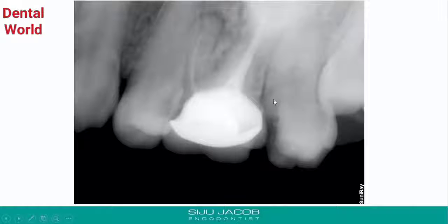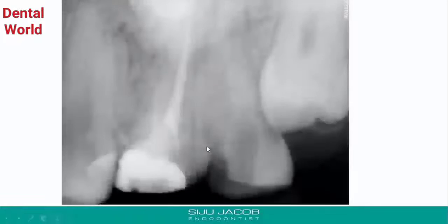I don't know what happened after that, but this patient came back after 6 months, and when she came back, I took a radiograph. This is what I found. Meanwhile the crown had disappeared. I'm not really sure what happened, but she was without a crown in this tooth, and there was evidence of an access cavity made in this particular tooth. And it's not very clear because there doesn't seem to be any canal in this tooth.